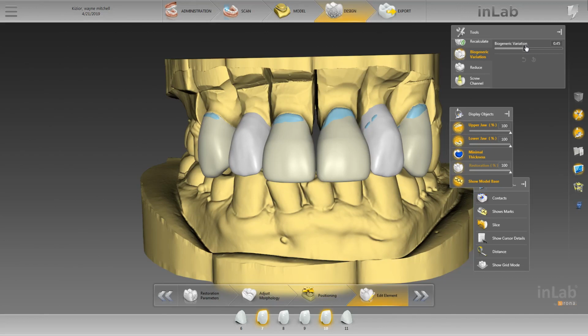And as we're doing this, before we made any adjustments, the teeth appeared a bit protrusive. It looks like they're coming out a lot. So let's focus on the gingival cervical aspect of the crown, and wherever we get something more bulbous, kind of like here, it's going to eliminate the illusion that they're coming out. So anything that we get more bulbous at the cervical, it's going to make the teeth appear more flat and natural, which is how you'd want it to look.